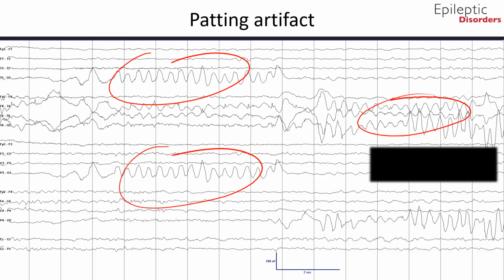Similar rhythmic or repetitive artifact can also be produced by electrode wire or patient movement from ventilators, percussive anti-bedsore beds, intra-aortic balloon pumps, and oscillatory ventilators. The shape of the artifact depends on the frequency of activation of the device and is usually a slow wave or mixture of frequencies superimposed on a slow wave and is typically stereotyped or monomorphic.